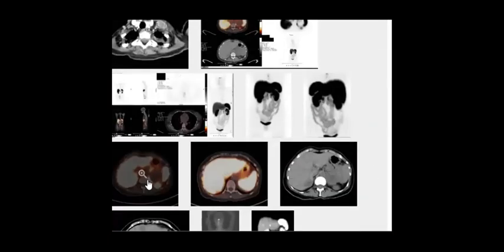The spleen may be involved. The lung is not healthy. Regarding again the physiological uptake of the colon and small bowel, sometimes we mention that it can be physiological. And regarding the urinary excretion as well.